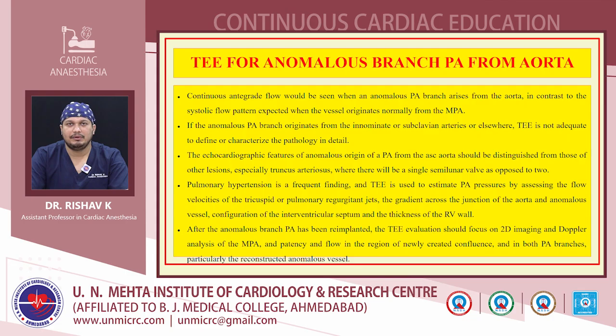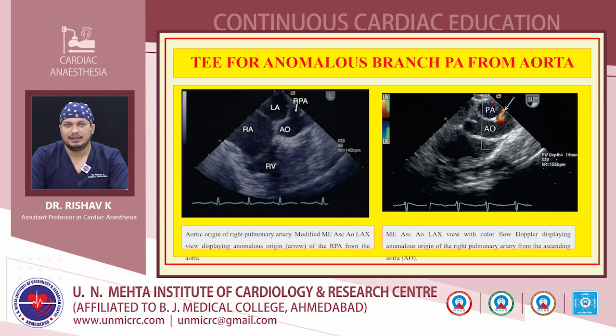Pulmonary hypertension is a frequent finding, and TE can be used to estimate pulmonary artery pressures by assessing the flow velocities of the tricuspid or pulmonary regurgitant jets, the gradient across the junction of the aorta and the anomalous vessel, configuration of the interventricular septum, and the thickness of the RV wall. After the anomalous branch PA has been reimplanted, the TE evaluation now focuses on the 2D imaging and Doppler analysis of the MPA and patency of flow in the region of the newly created confluence, as well as in both the PA branches, particularly the reconstructed anomalous vessel.